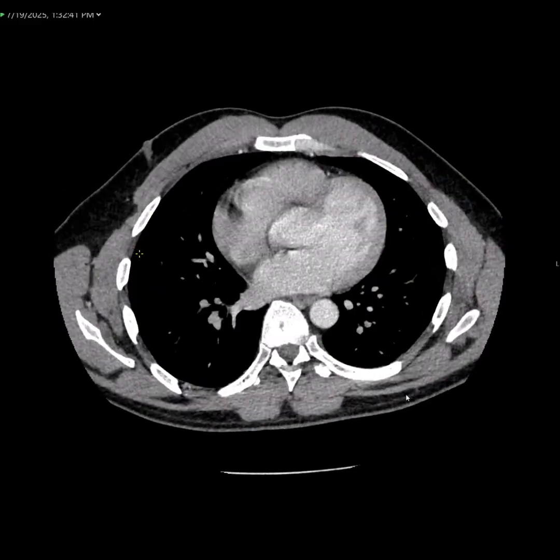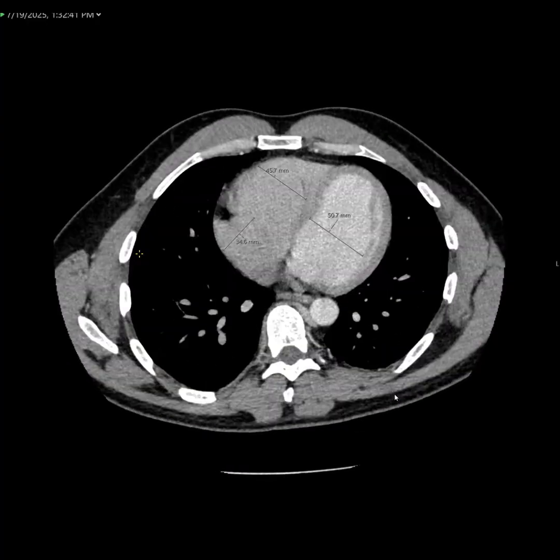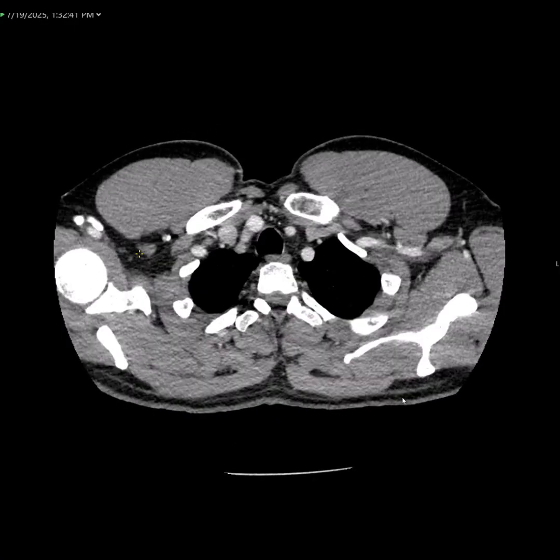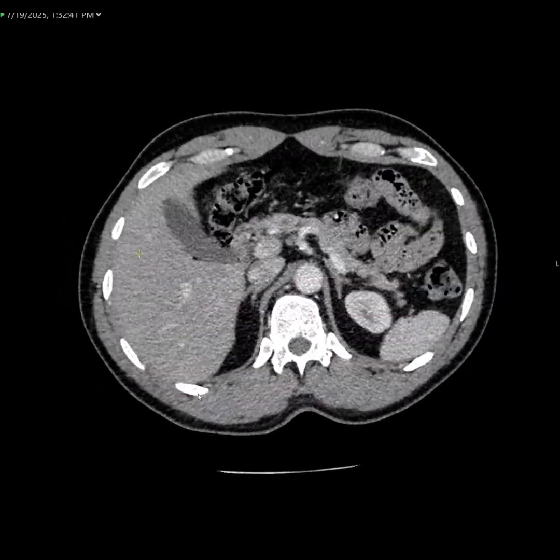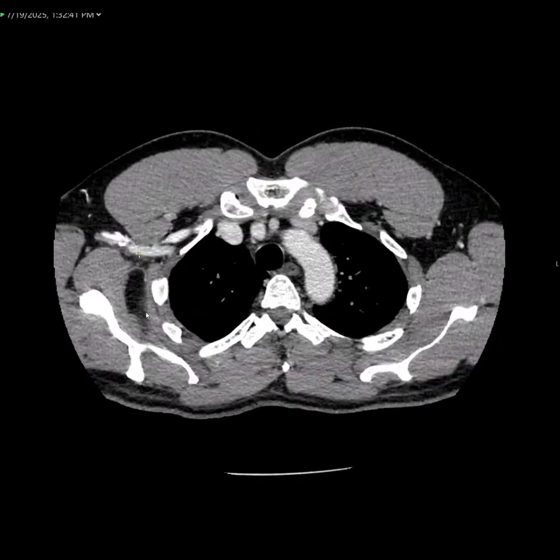If the patient has breasts, you also want to make sure to examine them at this time for any obvious masses or calcifications. Then going to the posterior section of the chest, again, scrolling up and down through the soft tissues, just looking for any obvious abnormal findings. And then working my way back into the left axilla.